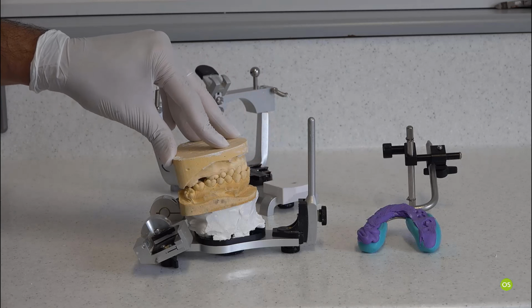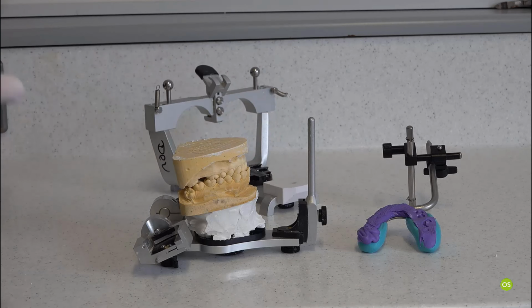And this is another thing I've noticed, is when you are doing crown preparation, if you're doing 2-3 crowns and if they're bounded by teeth, and if you're mounting model in ICP, you don't really need to take a bite registration if you have a good set of teeth.